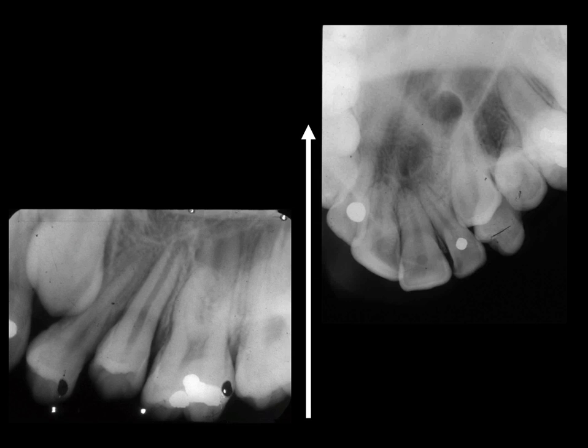As our perspective shift has moved to the occlusal radiograph, that is looking down on the patient, the crown of the canine has moved over the crowns of the premolar tooth. This means, once again, that we've proved that it's moved in the opposite direction to our perspective shift, that it is buccally placed.